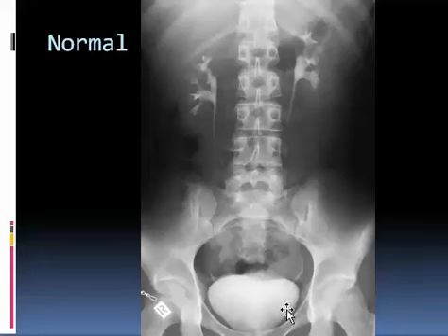And again, you should be careful that the shape of the pelvis is indicative of the sex of the patient. So here it is a female, since the pelvis is round and smooth and wide.